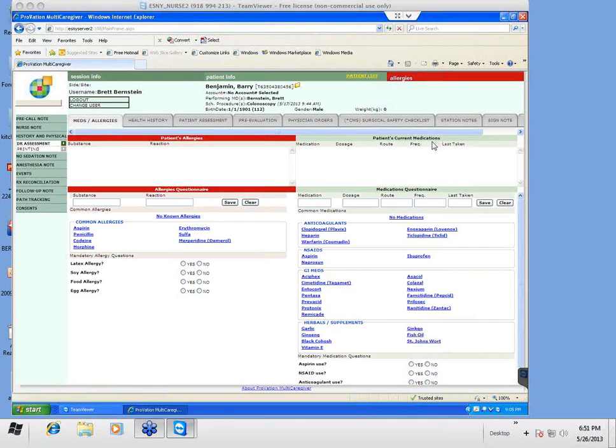Today's brief webinar will be on the use of the Provation Multicare software program. What I'd like to do is take you through a mock patient and the fields that need to be filled out appropriately to meet documentation requirements.